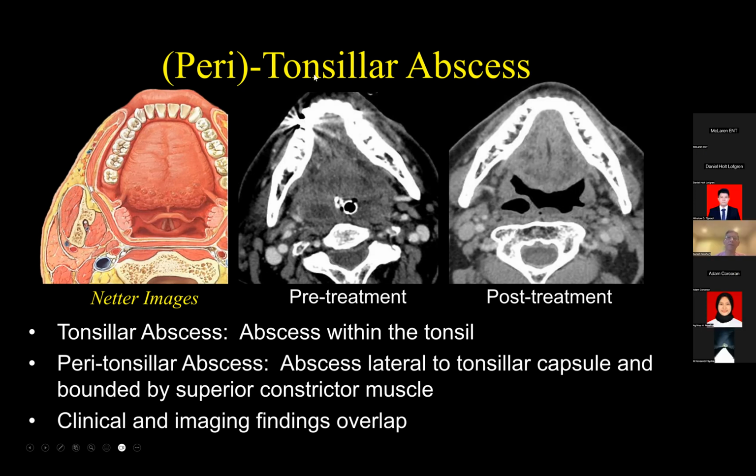Some people claim that, well, you can't have a real tonsillar abscess because if you did, then all of this lymphoid tissue that comprises the palatine tonsils would be basically immediately melted, if you will, due to the inflammation. And therefore, anytime you see an abscess, it has to be below the capsule. And this is what gives you this peritonsillar abscess. So I don't know what the actual terminology is, what's being taught. Maybe it varies in the ENT literature too.